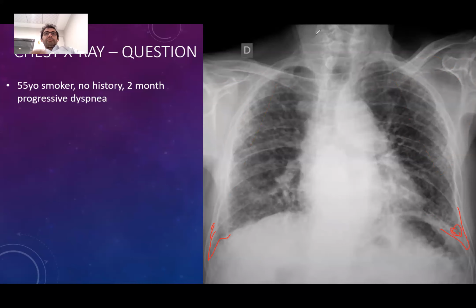Maybe there can be very, very small effusion, but I think it is mostly due to the nodular densities on the lungs. And there are no costal fractures. When I look at the lungs, I'm seeing that the lung area is very coarse. There are a lot of opacities in the lungs. Most of them are reticular opacities. Some of them are nodular opacities, right? I'm seeing a lot of nodular opacities on both lungs as well.